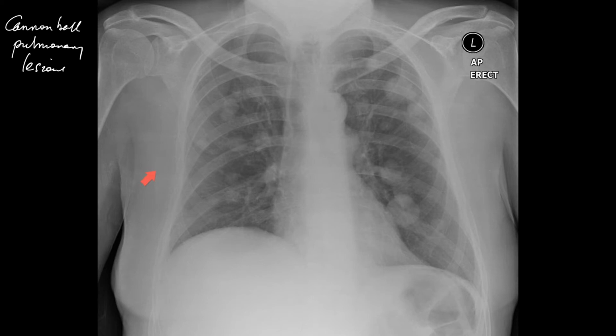And therefore I can work out by a process of logic that these are highly likely to be pulmonary lesions and not skin lesions. And I can definitely say that they are not bone lesions because the diamond is not clear. The lesion protrudes into that diamond, which is devoid of bone.